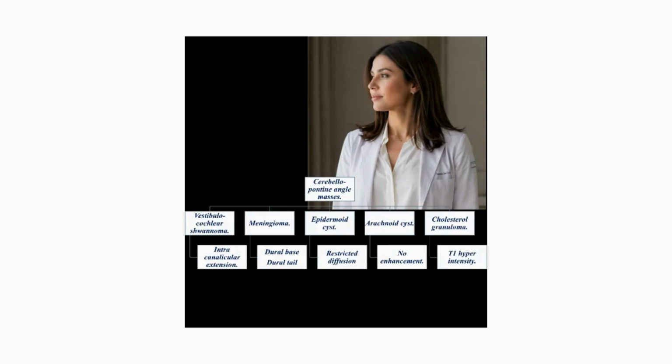The most common lesion, which is vestibulocochlear schwannoma, followed by meningioma, epidermoid, and arachnoid cyst. In addition to cholesterol granuloma, differentiation of these lesions are mentioned in smart art. In radiology, the story is in the details. Don't let the CP angle remain a mystery.